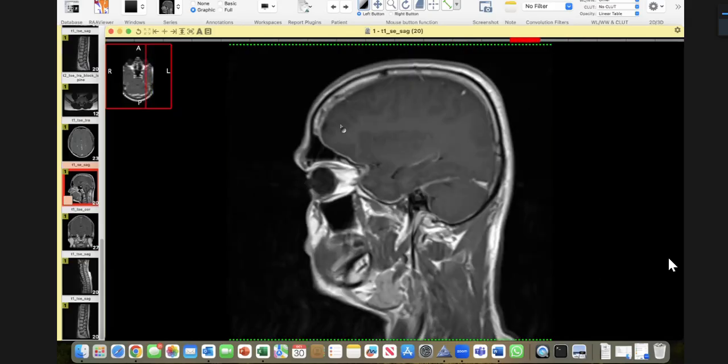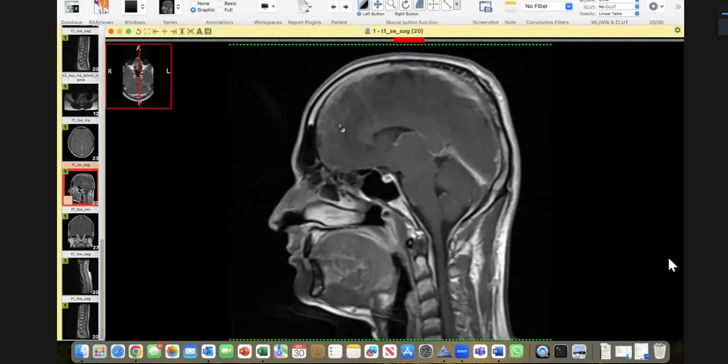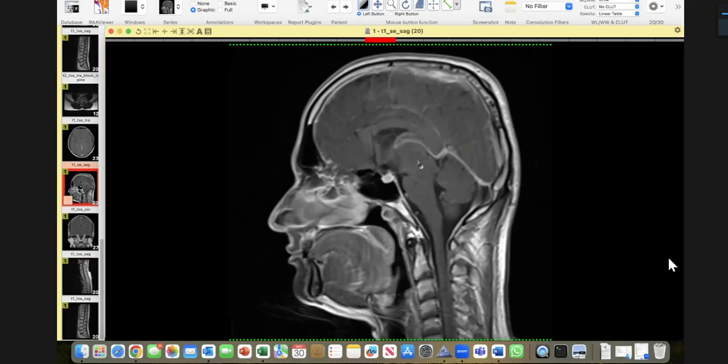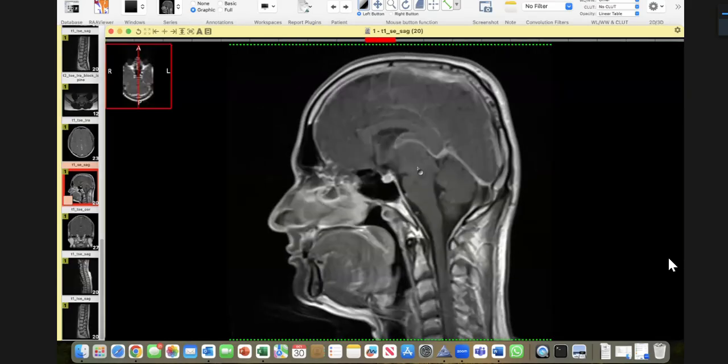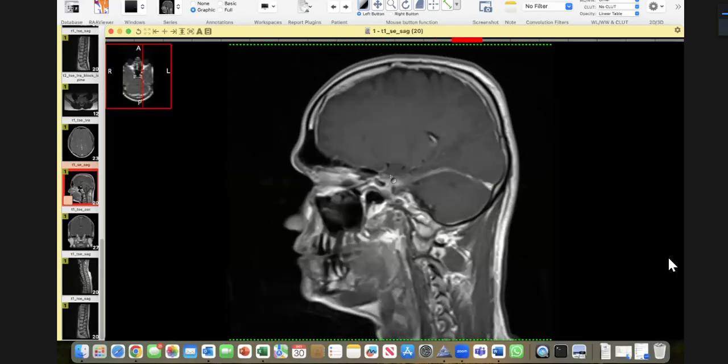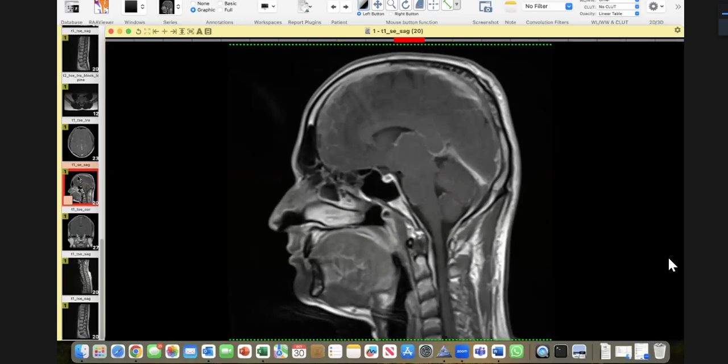And you did pick it up once I showed you the sagittal. This is the post-contrast sagittal, where you can see the midbrain is sort of drooping down, and the pituitary gland is also quite congested, prominent there. So this was intracranial hypotension. And if you see carefully, even here, there is enhancement in the cervical spine. Okay, then, thank you very much.